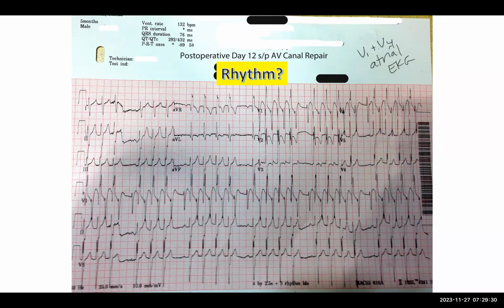So I think a lot of it would depend on what the fastest or best 1-to-1 conduction in this patient is. If the 1-to-1 conduction can go to 150, in this case we're at like 155, but what we don't know is if it was at 150 or 147, would it conduct 1-to-1? And although it is not normal to start Wenckebaching at a rate above that, it is probably safe enough that we could send a patient home like that with close observation. So I agree with you. I probably would not put a pacemaker in such a patient.